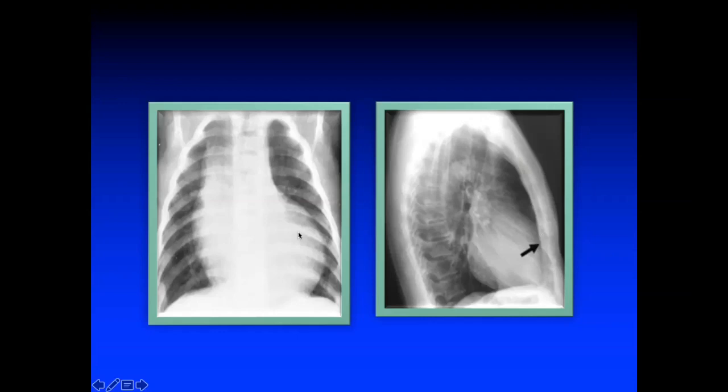So these are the classical X-rays which you get in the exam of tetralogy of Fallot, and that is how you describe an RV apex and an LV apex: acute angle, obtuse angle, and the direction of enlargement. Here you can see the RV apex is going along the left side, so it is horizontally displaced. In an LV apex, it is obtuse and there is inferior or downward displacement. With that, you can clearly make out an LV versus RV apex.